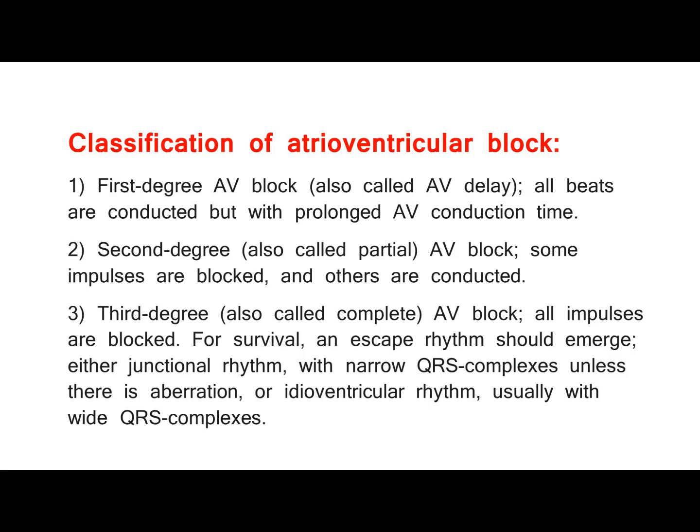For survival, an escape rhythm should emerge, either junctional rhythm, with narrow QRS complexes unless there is aberration, or idioventricular rhythm, usually with wide QRS complexes.